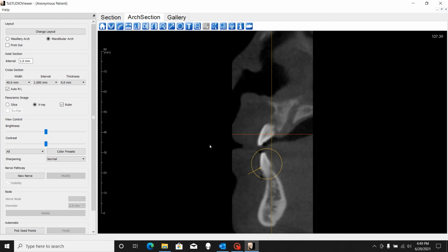And then text, you can actually add text to that arrow or that circle in order to point out what you'd like to say about that. So once again, to take those things away, you turn it to red and it goes away. Turn the circle to red, it goes away. Turn the arrow to red by clicking on it and deleting it with your keyboard, and those things will be removed.